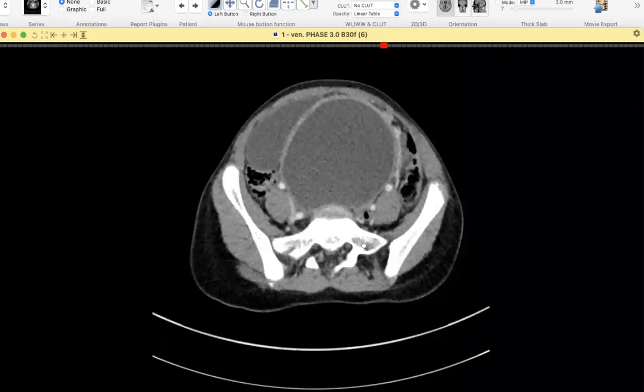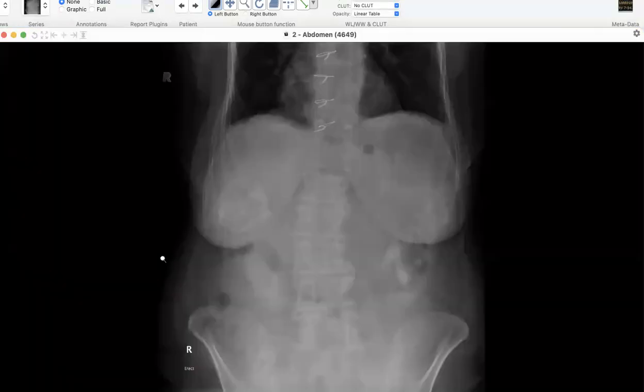No issues. So the last case was actually 4 cases in one. I thought we would get through the initial cases quickly, because they were borderline direct cases. So like you said, a large differential for this: it could be from the breast, it could be from the liver, it could be from the gallbladder. But if it's from the liver, then the calcified hydatid makes more sense.